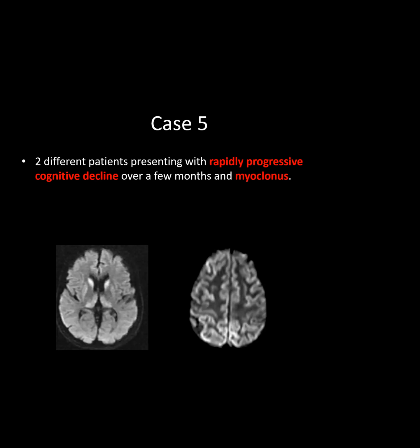Let's see. Sergio? Yes. Okay. All right, we're still talking about infections. So take a look at this case, look at the stem, and look at what's abnormal. These are two different patients, and tell me what you think is abnormal. Hold on one second. Okay.